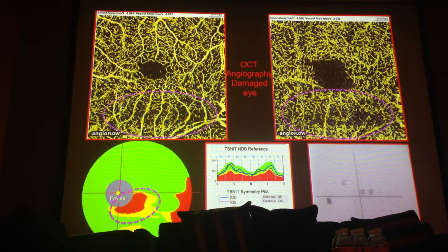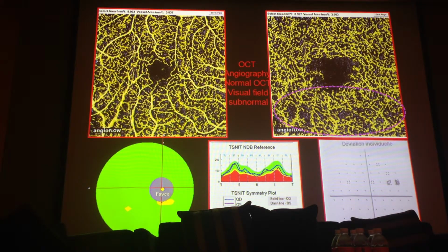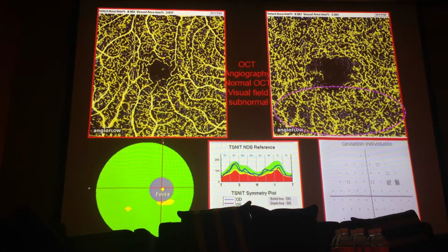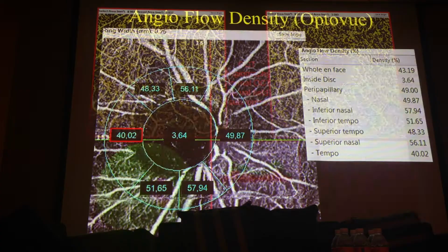It's a very thin cyst in this part of the retina, and you can observe in this case how it appears in this part of the OCT angiography, and in the deeper layer of the OCT angiography. And another example will be there. We have almost no response on the superficial layer, and we have a response on this layer. So it's very, very rare, but we can make a correlation with glaucoma.